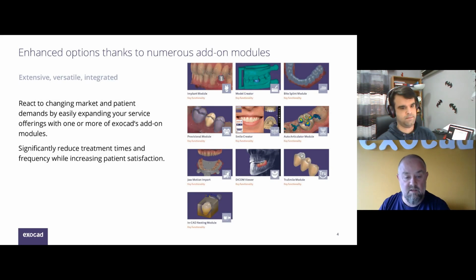Quite an interesting tool as well is the InCAD nesting module, which allows you to place the restoration already in the blank, or rather, you place the blank on the restoration to make sure that the layering corresponds to the desired layering in your restoration.